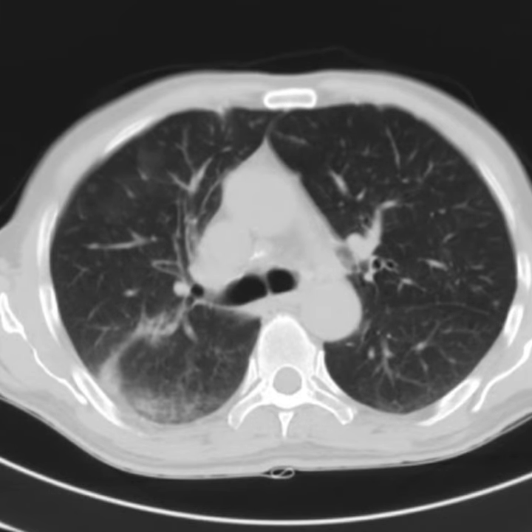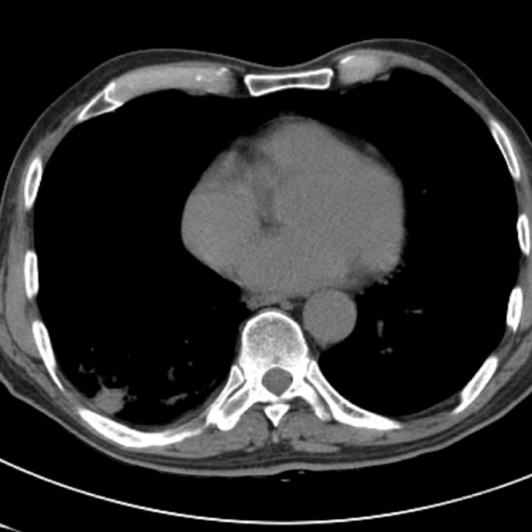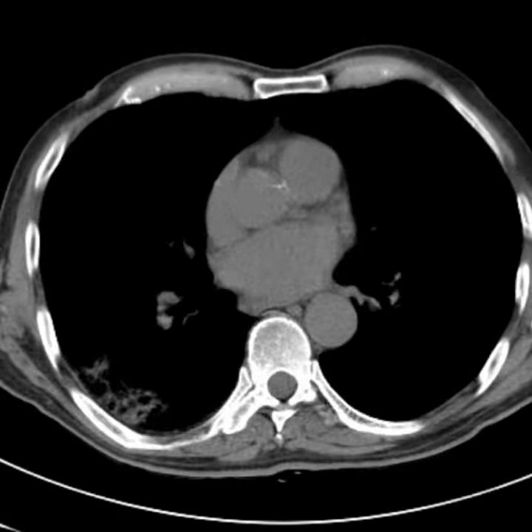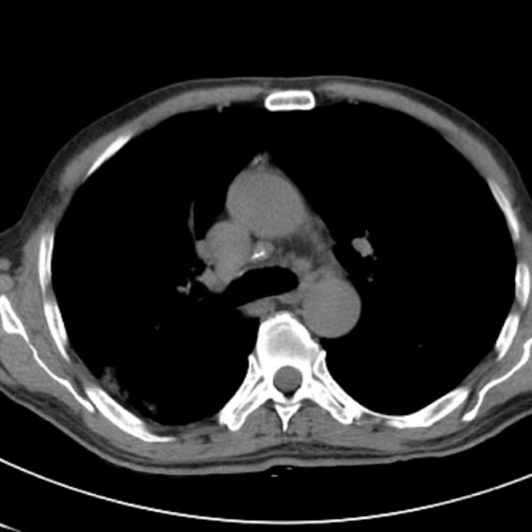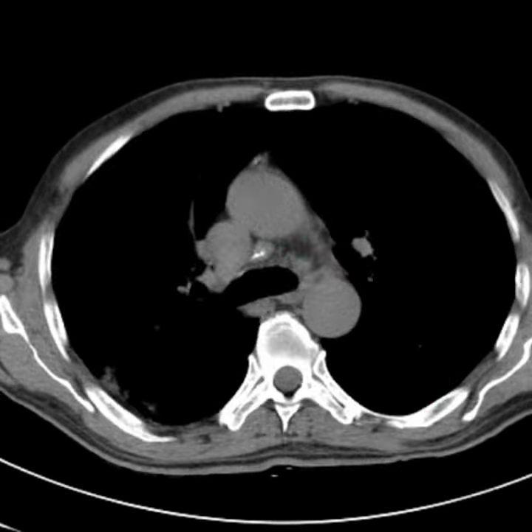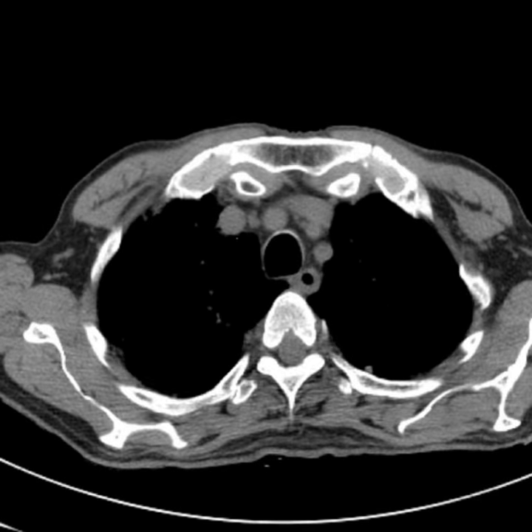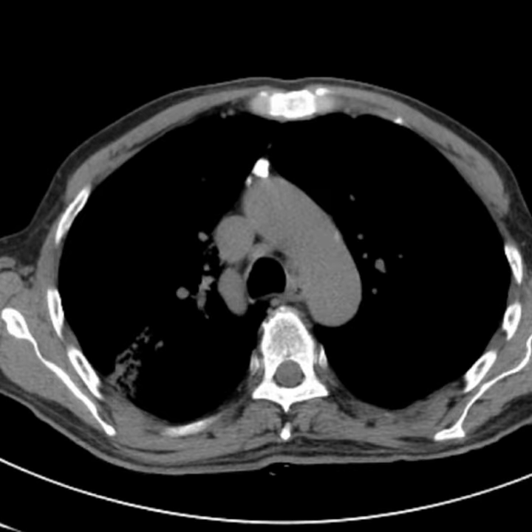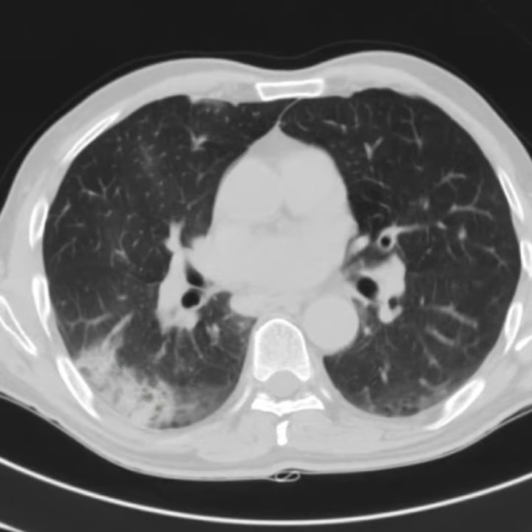And if we go to the soft tissue window, we can see that there is no pleural effusion, and there are only a few small mediastinal lymph nodes here and there. Again here, some small mediastinal lymph nodes, probably not much of a significant mediastinal lymphadenopathy. Excellent. So, what's your impression of that?